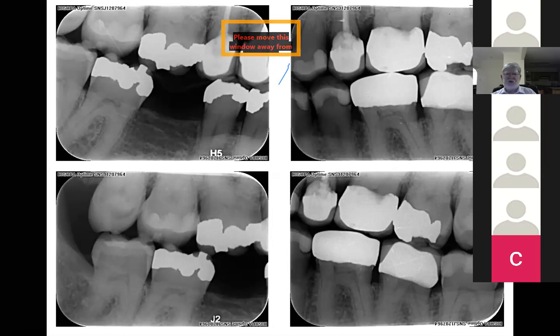The reason for these radiographs is similar to the case where we came across the dentigerous cyst. When I see a patient and the span of the arch going from mesial to distal is very long, and I take a left bite wing and a right bite wing, and I'm not seeing enough, I will then take 2 further bite wings on that patient. I will charge them for 2 x-rays. I will take 4, simply because I want to see more. Just in case you miss out on stuff.